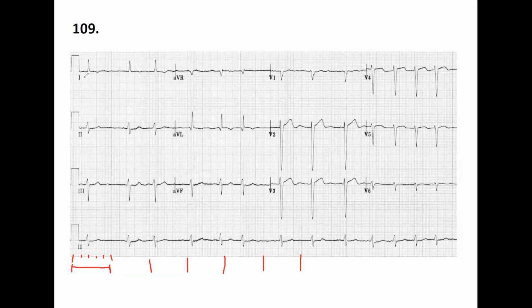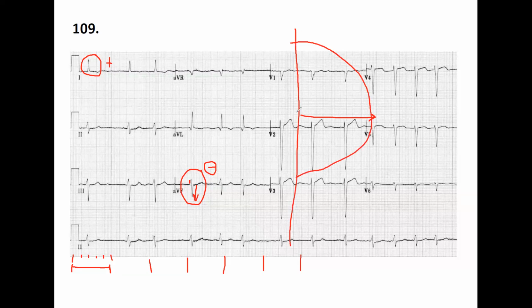I'm not really sure, but look at lead 1. Lead 1 is positive, yes. Good. Also AVF is positive? AVF is not positive. AVF is negative. It's more negative than positive. So it's negative. That's positive. That's negative. What does it mean? Lead number 1 is positive, so you are on the left side. AVF is negative. So we are again here. This is the left.